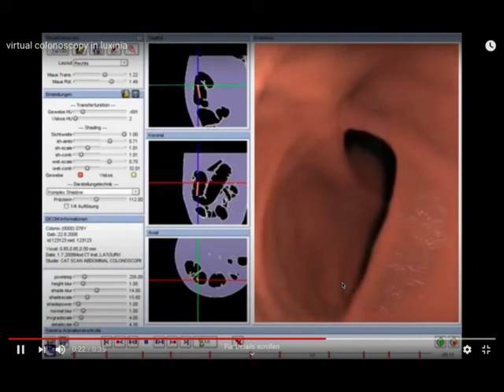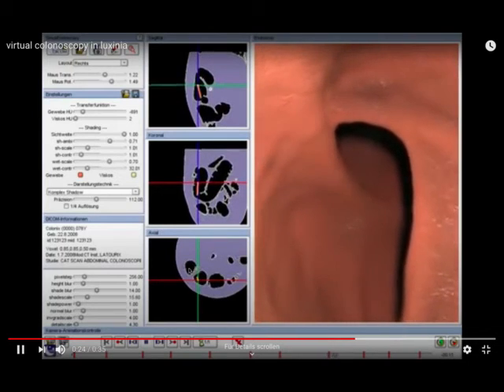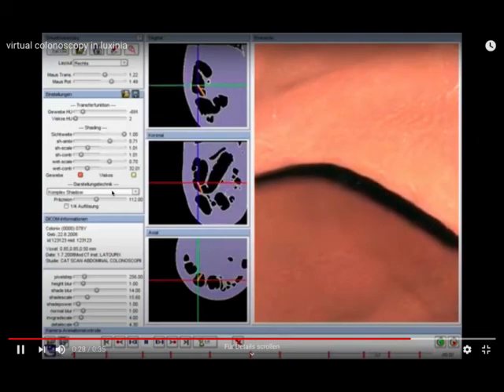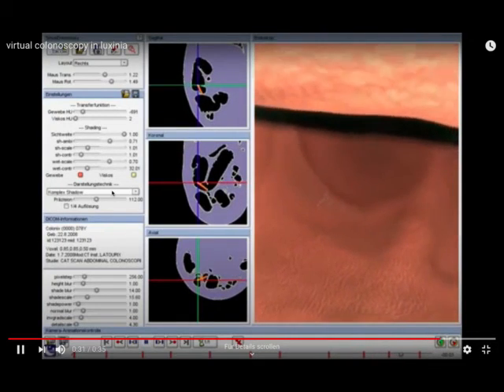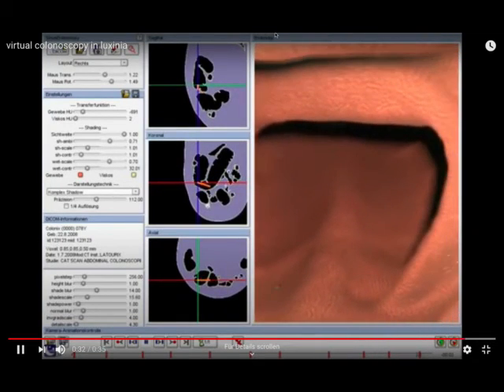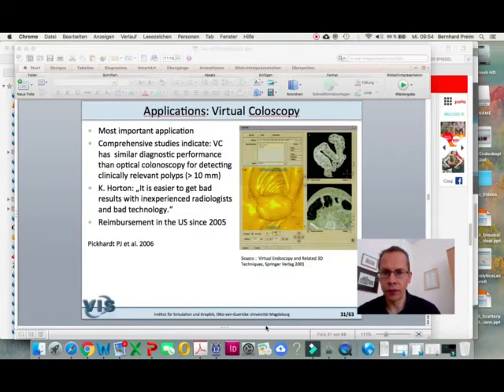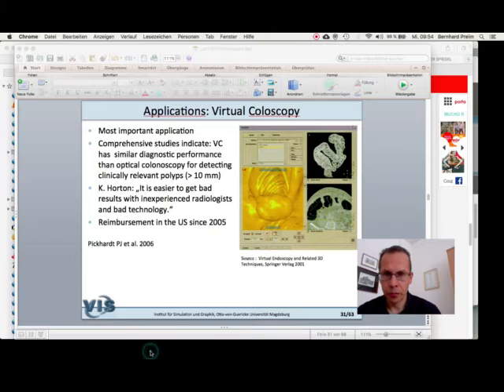I think that gives a good impression also of this user interface here. That was in this stage, as I mentioned, a bit too complex. So maybe that's sufficient. Back to the presentation.